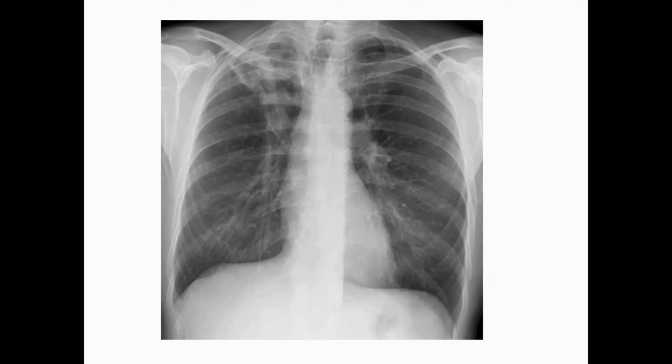Left apical and right apical, do you see any changes? For sure, there's a change here. There's a dense shadow in the right apical zone. Even there are some sort of cavities inside it. Look, you see these cavities? The cavity.